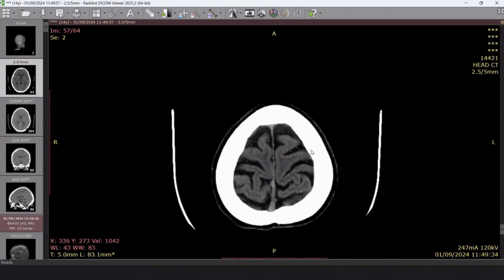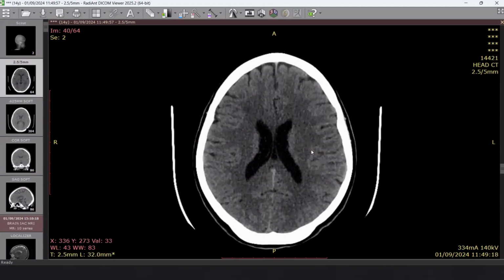Any history of recent fever or vaccination or anything? Yeah, when we asked, the patient complained of an acute chest infection 3 weeks ago. 3 weeks ago. Yes. So then I also have another differential of ADEM, acute disseminating encephalitis. Yeah, that was one differential.